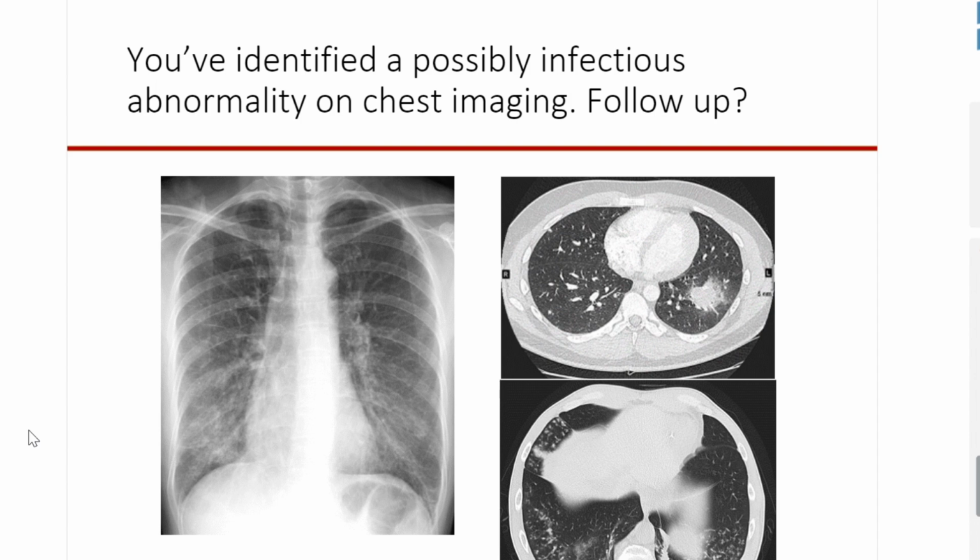Same thing with these two CT scan images on the right, all right? This could be just called a consolidation, but I think we all can see that there's a ground glass halo around it. It's also peribronchovascular in its location, meaning it's sitting on the vessels and airways. That's one of our most powerful descriptors for bad organisms. And I'm going to describe to you what I consider bad organisms.